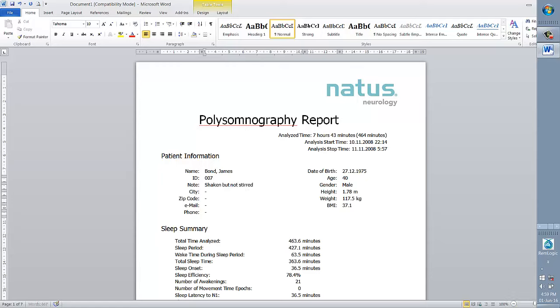Okay, so what I'm going to do now is let's log into Enterprise and search for Mr. James. Okay, so this is the study that we have actually published just now. If I double click on it, you see all the study information here. And what will be the most interesting thing is under the analysis parameters.